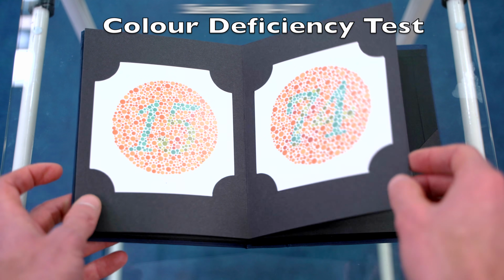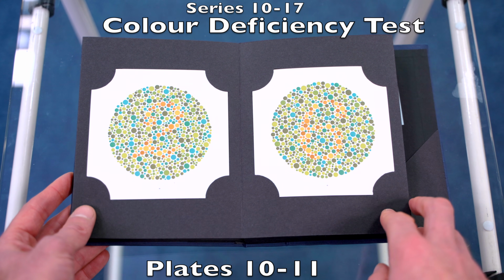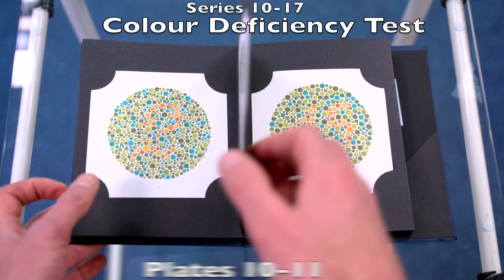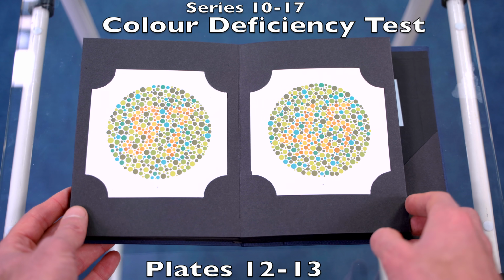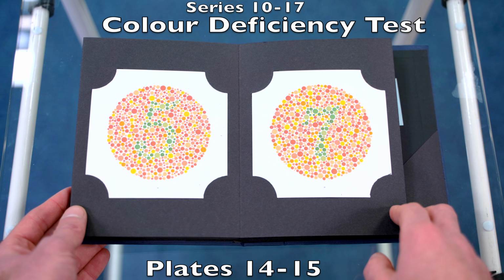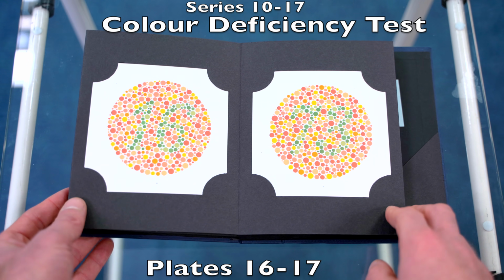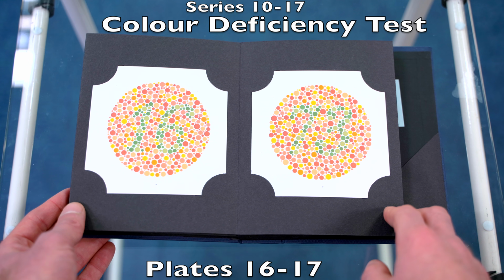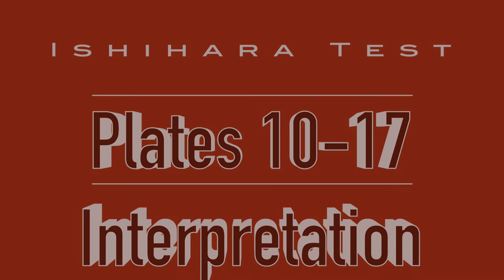We're going to column 2. Plates 10 and 11, 12 and 13, 14 and 15, 16 and 17. Now we asked you to go over to the second column here for plates 10 to 17.